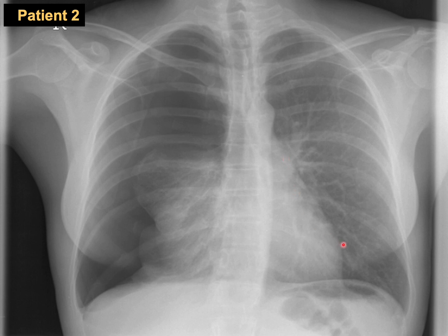Okay, D for the bone, we cannot see any problem with the clavicles, humerus, shoulder joint, and if you go through all the ribs, you will find that there is no abnormality. So in this patient, we have pneumothorax on the right side. Is it tension? For what we have here, we are not very sure. There is radiological evidence that this patient may have a tension pneumothorax, but always remember that tension pneumothorax is a clinical diagnosis. If this patient has low blood pressure, if this patient has hemodynamic instability, then this means tension pneumothorax. Tension pneumothorax equals pneumothorax plus hemodynamic instability.